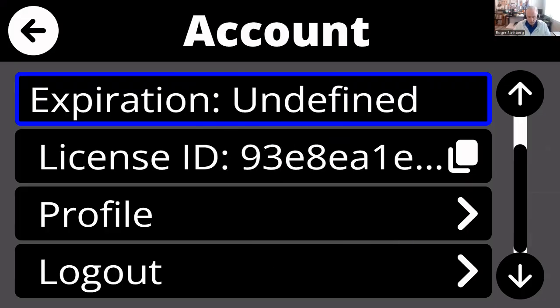And then at the bottom, I wanted to point out also down here, this log out option. This is actually logging them out of the software. You use a username, which is your email address, and a password to log in. As I pointed out earlier, I know you probably can't see through my camera very well right now, but I have in the back corner behind me my Surface tablet there, and I have that all-in-one. Those both have Prodigy installed on them, as does my work laptop. So that's 3 installations right now that I'm using with the same user profile.